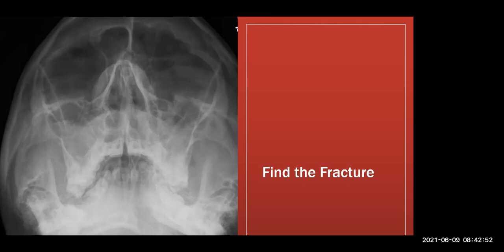We go across there. Again, we don't see much. Agreed. There really isn't much. So this is the time when you say to yourself, but look at this patient, because even on the X-ray, you can see the amount of swelling. The swelling is quite extensive, right? So that amount of soft tissue swelling means that, okay, on the simple lines, I can't see what's going on. Let's look at it in a bit more detail.